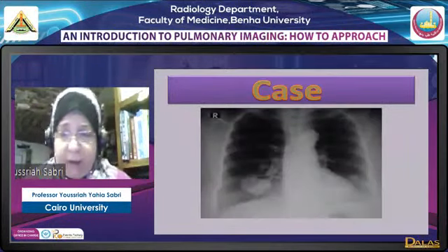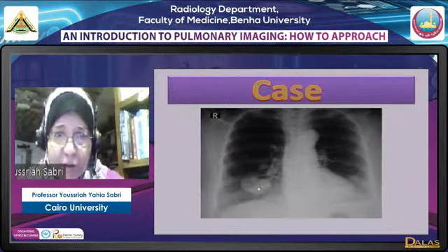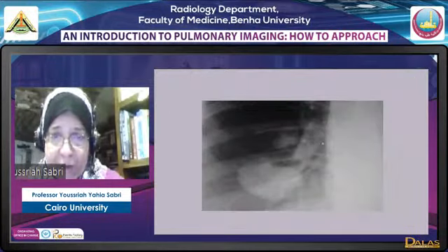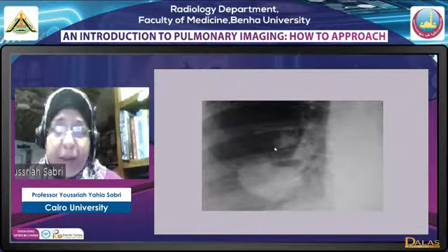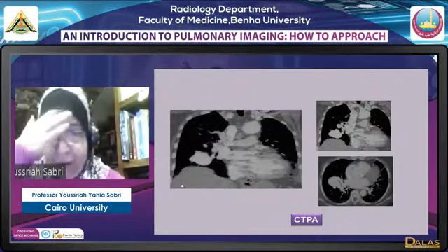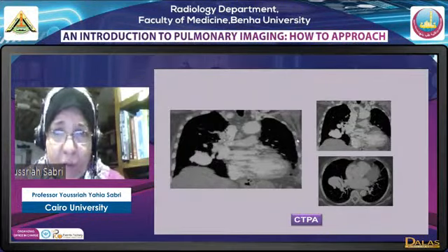Here is another case. This was an elderly female coming with hemoptysis, chest X-ray showing a lobulated large mass, with prominent interlobar artery related to it, and another lesion. Again, AVM consider. CT was done, and the CT pulmonary angio is relatively old, about more than 15 years old. Okay, the appearance is typical of AVM with multiple lesions and supply from the interlobar artery and drainage in the inferior pulmonary vein.